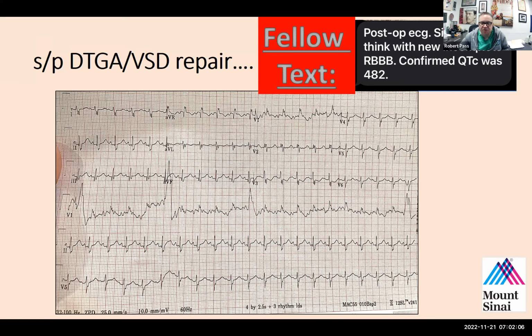Why don't we go to Molly? Molly, do you agree with your co-fellow's comments on this electrocardiogram? I agree with the sinus portion.